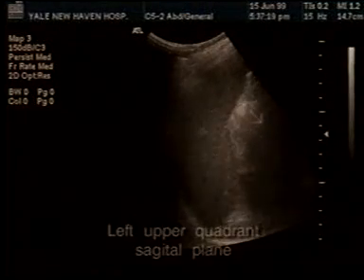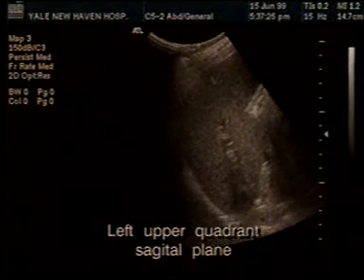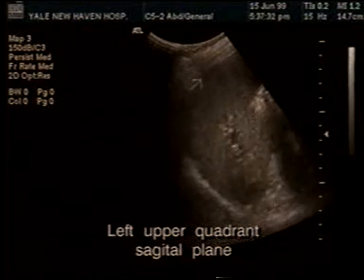To a lesser extent, there may be fluid in the left side of the abdomen. In the emergency room now, they are looking in the 4 quadrants as a possible way of looking for fluid collections, such as blood. You may see it around the spleen here, because again there is a peritoneum between the spleen and the left hemidiaphragm.